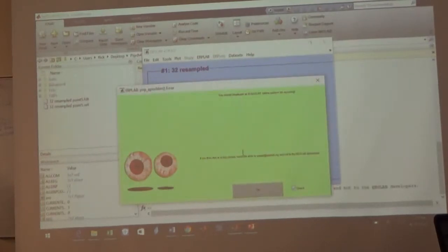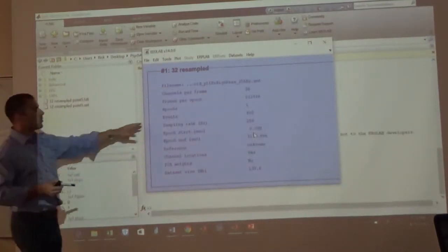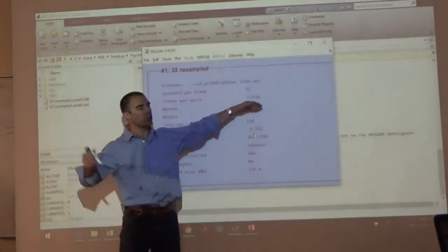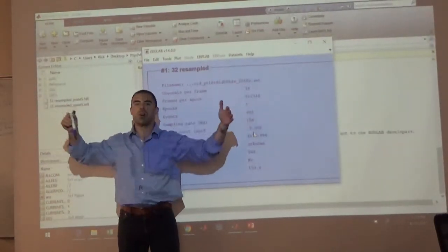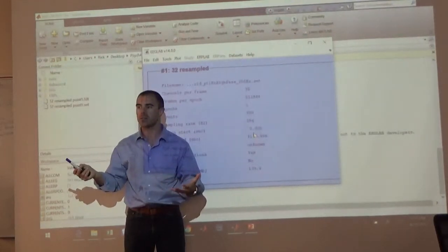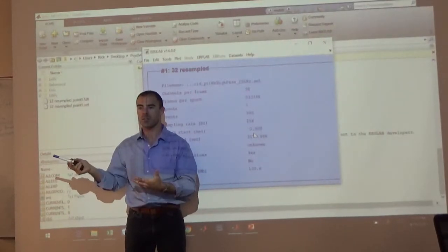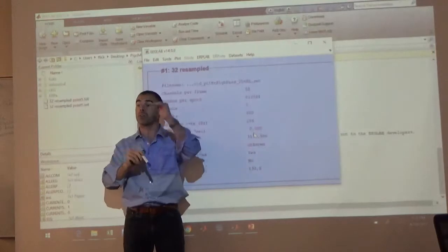Oh, no dice. We gotta create an events list first. Well, golly. We want to epoch the data not just in one long slice, but we want to slice it up into all of our events, right? Why wouldn't it let us do that? What did the message say? We got to give it a list of all of our events.